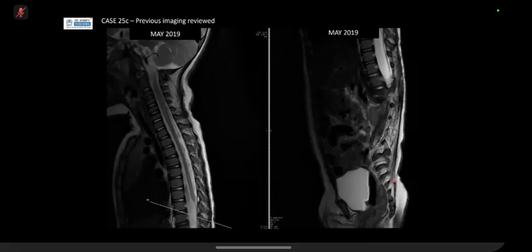Do you still see, I know I only give you the slides, but on the right hand side of the lumbar spine or lower spine, do you see that big lesion anymore? The patient had aggressive treatment. They've given him, I can't remember what they give to treat neuroblastomas, but essentially they gave him the all clear. There is a residual small lesion seen in the mid-lumbar region. Yeah, possibly this that you're looking at. Okay.